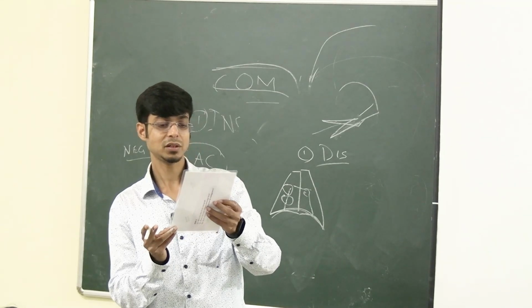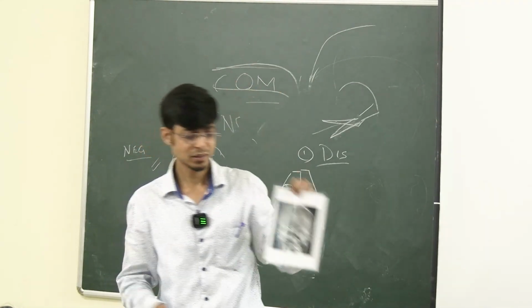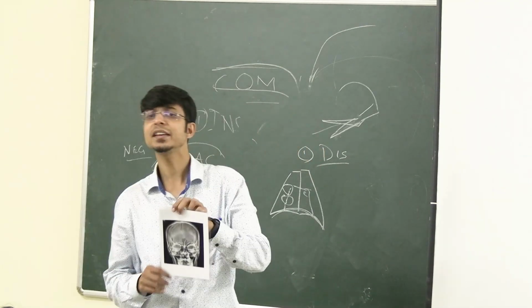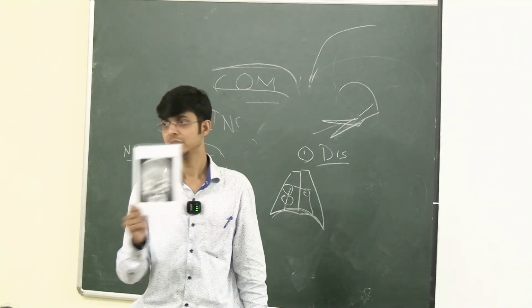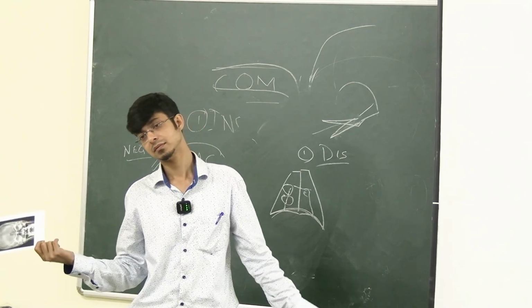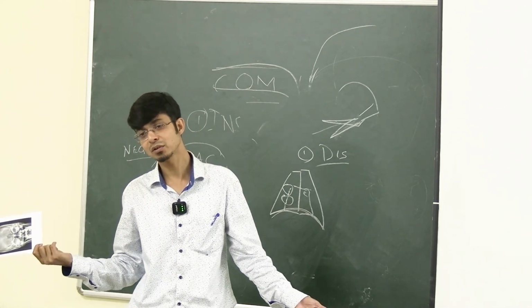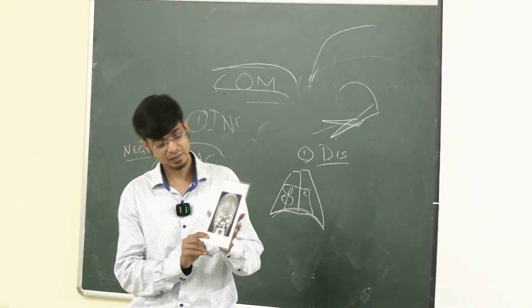Do you understand? Look, now first tell me, look from a distance first and say, if you are given this X-ray, what would you say? It is the base of the skull. What are you saying, Ayush, today? What happened to you? You are talking nonsense today. Think about it. Where is the base of the skull?